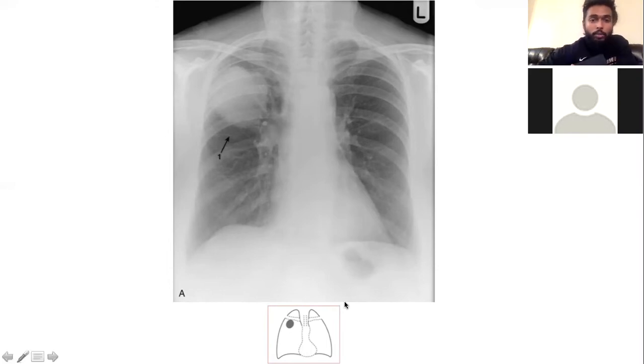Right, beautiful. But if you just wanted to be sure, let me see. So this is one, two, 3, 4, 5, 6. Six. Lateral part of the sixth rib right here. Hilum is right here. That's your fissure, where that number one line is, where they pointed. That's your fissure. So anything above that is going to be upper lobe. Anything below that could be middle or lower.